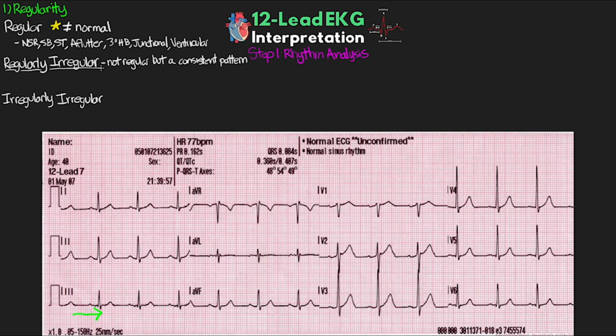So some examples of this would be things like potentially atrial flutter sometimes, second-degree type 1 heart block, so our Wenckebach block, as well as bigeminy and trigeminy. These are going to be irregular, but there's going to be some sort of regular pattern to this irregularity of R to R intervals.